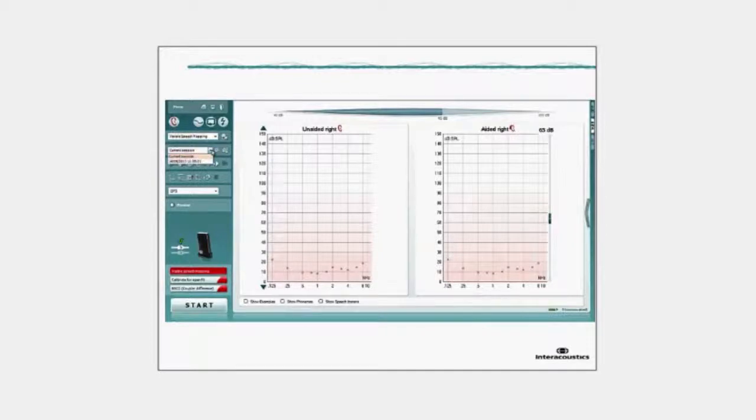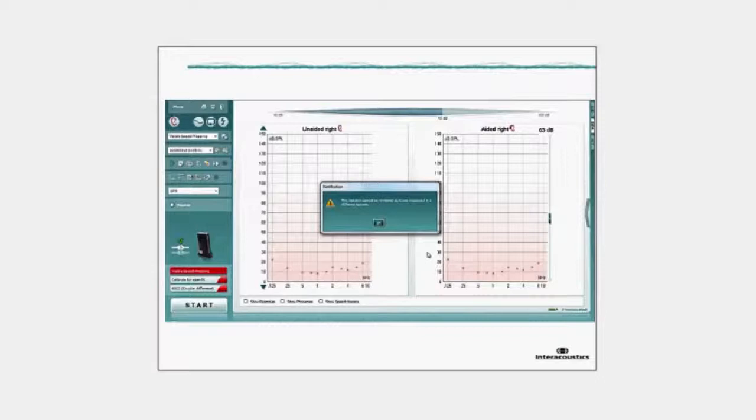And now when loading this, you'll be shown that notification. Because it was small, I've shown it in the previous screen, but it actually says you cannot review this as it wasn't measured by a Callisto. And this just gives ease of use and handling of the data.